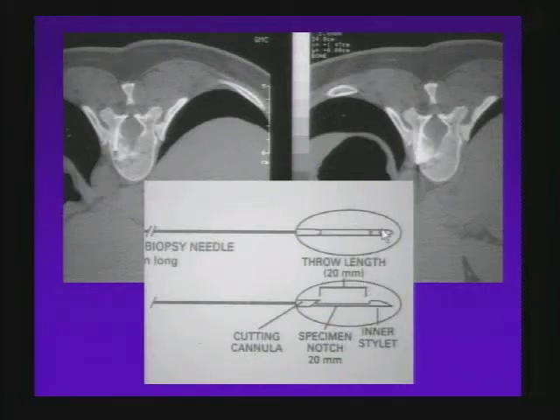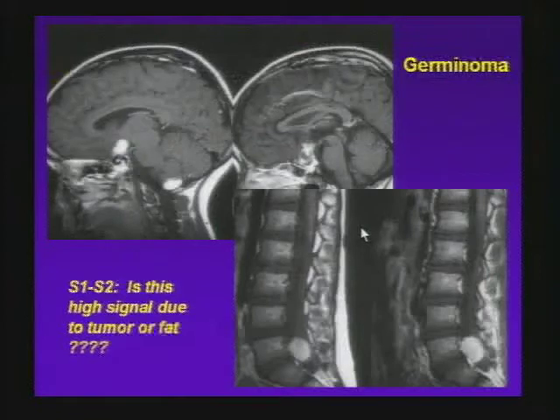They were able to get estrogen receptors, figure it all out, and they couldn't find the primary cancer on a mammogram. But this was metastatic breast. So obviously you make friends with your referring clinicians if you do those procedures. Not all the mets go to the vertebra. This is a germinoma where literally the metastases have exfoliated off to the cerebellum and down to the lumbar region.